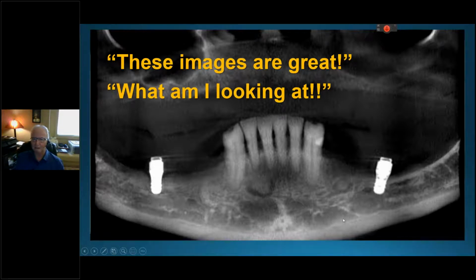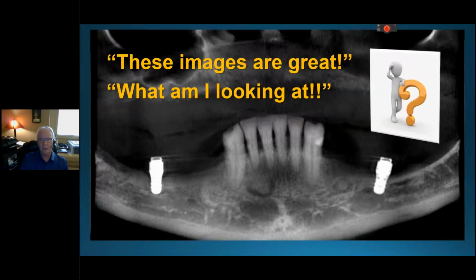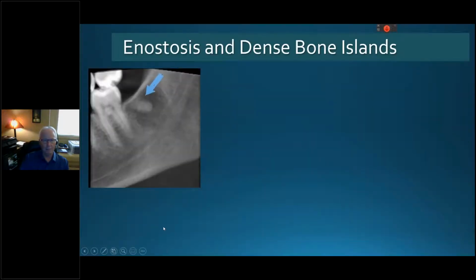Because you have a whole different slew of anatomic sections to look at, and you can see 3 planes of section all at once on some of your interfaces for the machines. So you're going to question what you see. You'll have to, of course, maybe review this, maybe review some things in the textbook, go bird booking as I call it, and you'll come up with some of the entities we're about to discuss.